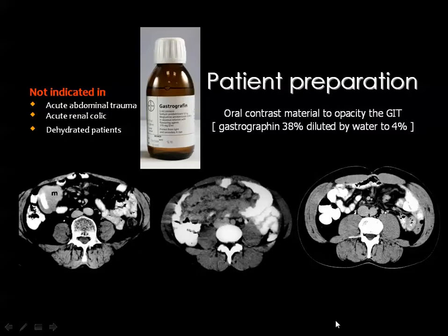This is another example where you can see a mass in the abdomen, and through this mass you can see an opacified bowel loop going inside it, indicating that this mass should be of intestinal origin. You have to look for this loop of intestine, whether it is small bowel or large bowel, in order to reach the differential diagnosis.